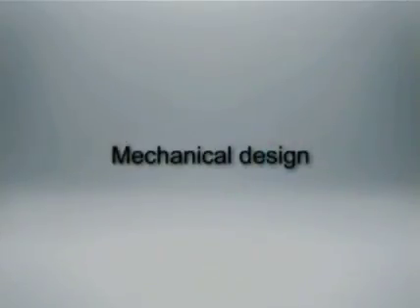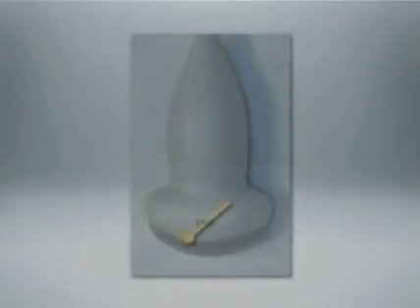The second issue is the mechanical design of these transducers, and that's illustrated in this animation here. What these transducers are is really an incorporation of a mechanism that sweeps through a volume and acquires the 3D volume. But it takes time to do it because it's a mechanical process. Furthermore, the mechanism of the transducer is bathed in fluid.